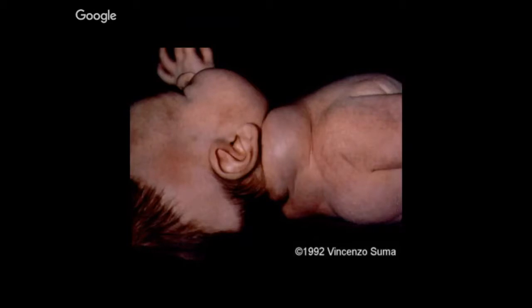Yeah, agreed. Unless we shouldn't call it cystic hygroma, because cystic hygroma comes from old nomenclature, and it's related to like bad syndromic illnesses. And so you don't want to call that the cystic hygroma, because it's actually just a lymphatic malformation without any syndrome. Okay, but you're right. So what do you want to call it then? Lymphatic malformation. Okay.